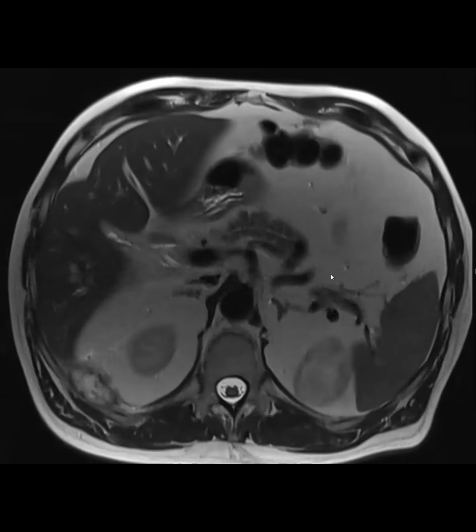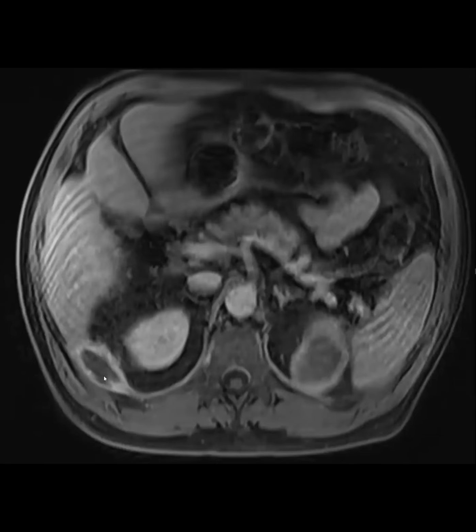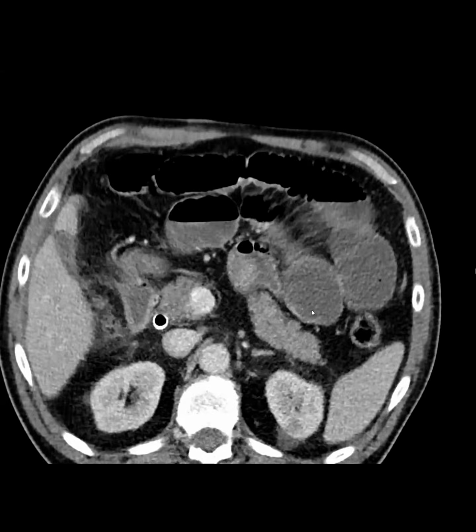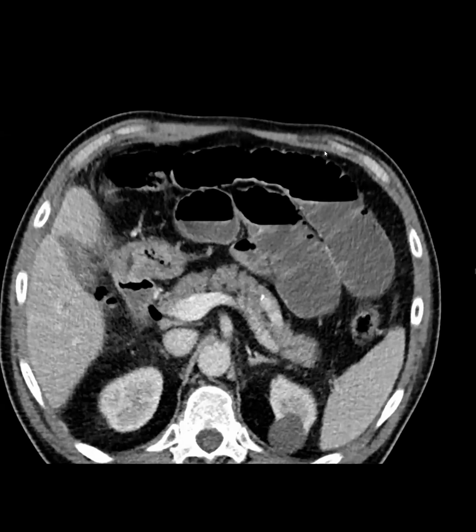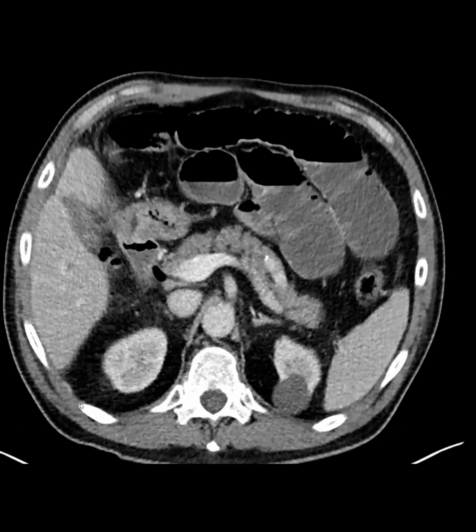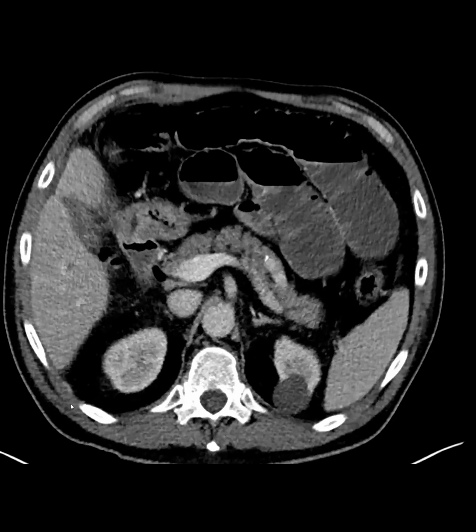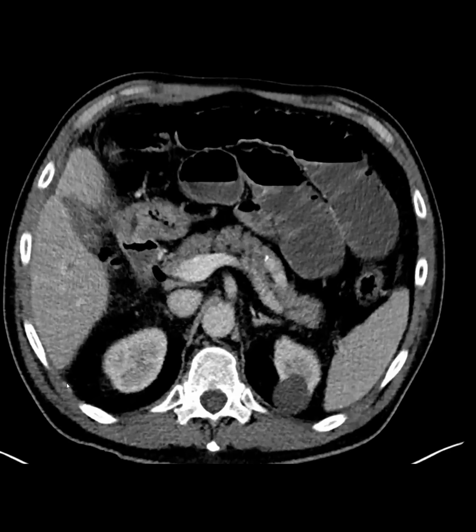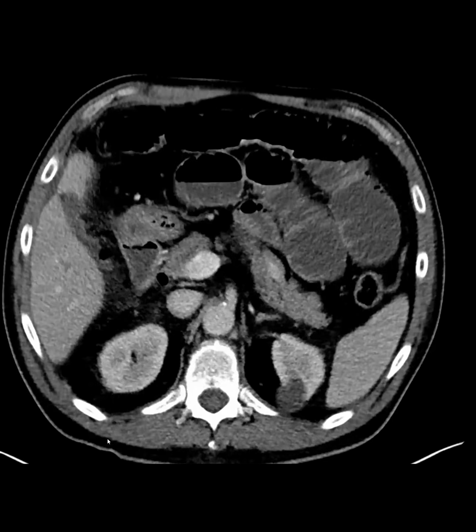Okay. Sometimes there are dropped gallstones that can develop into an inflammatory process in that space. Exactly. So this was dropped gallstones with a chronic abscess. This is a classic location, as they like to drop into this dependent space. And just for comparison, I'm going to show you a prior CT from a few years earlier. You can see some tiny hyperdense foci here, right? Those are the little dropped gallstones that eventually caused a chronic abscess.